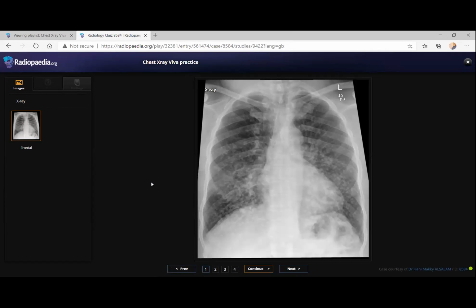If the origin is a papillary thyroid carcinoma, it could be a little bit calcified. You have to use the term miliary nodules because you can pick up each nodule. Miliary means with a forceps you can pick each nodule. So if this patient is acutely unwell, I'll think of miliary tuberculosis, with lethargy, weight loss and all. If this patient is already a known case of malignancy, I'll think of the possibility of miliary metastasis.